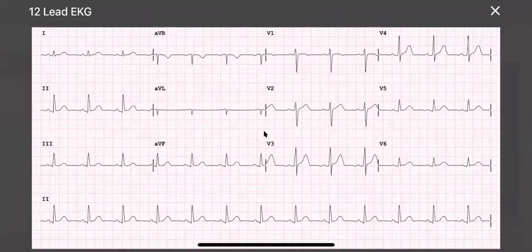And of course, if they do a 12 lead on the monitor, then when the 12 lead is run, it's going to also be broadcast not only to the student's monitor, so they'll have the ability to view it where they're performing the scenario, but it also comes to anyone who's on the Engage app on that same Wi-Fi. So that 12 lead will pop up on the screen here, and you're able to view the 12 lead.